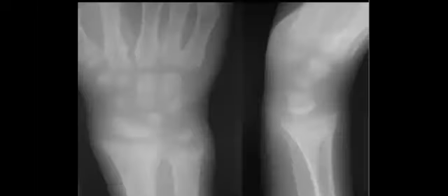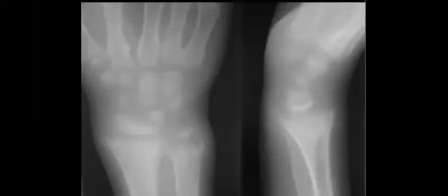Everyone agree? Okay. Let's go to another case, which is a spot diagnosis or Aunt Minnie case. Kids. Rickets, perfect. And how do you describe this appearance? Distal cupping and fraying. Yeah. In addition, with diffuse osteopenia of the bone. Yes. So cupping and fraying of the metaphyseal portion of the bone, so metaphyseal region mainly.